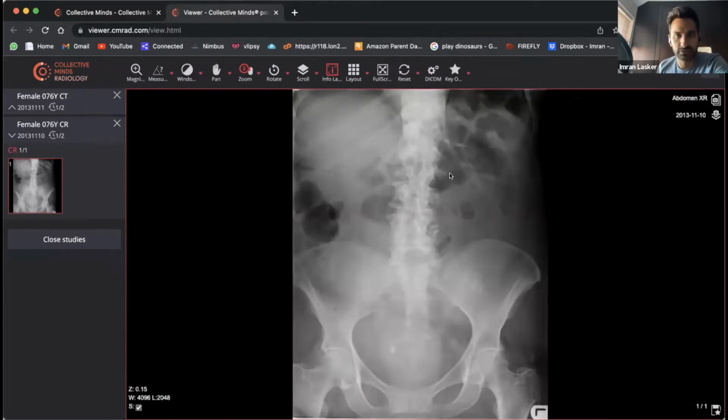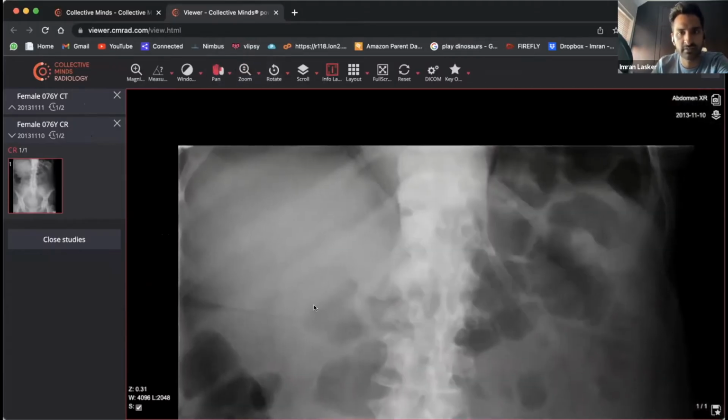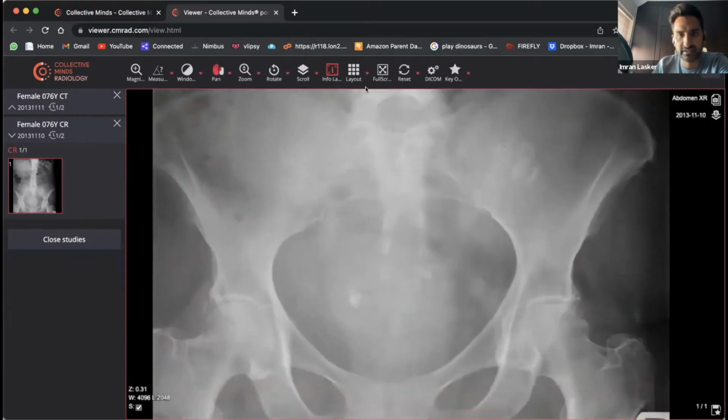They've definitely got abdominal pain, right? So it doesn't feel like there's much going on right at the moment. Let's zoom in a bit, see if there's anything going on. Please feel free to throw in whatever you think may be going on. But bowel-wise, it doesn't look like there's very much dilatation going on.